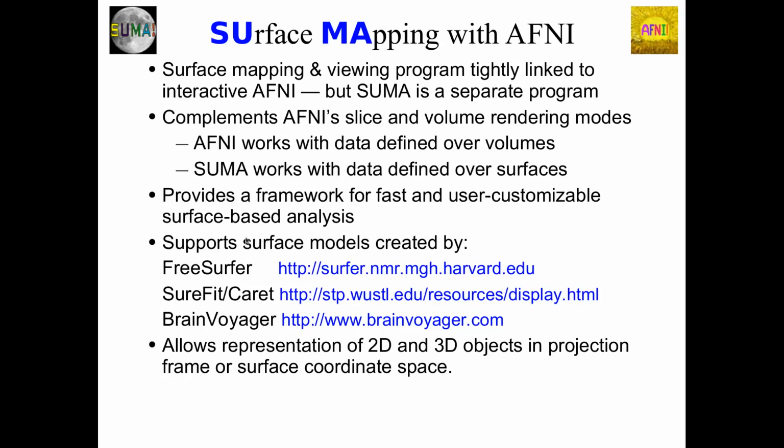A lot of the same kind of functionality and development style from the main AFNI programs also applies to the SUMA programs. And one question is, where do we get the surfaces from, these kind of nice anatomical surfaces that we see? We can generate surfaces in AFNI, but for really very detailed ones we leave most of that estimation to other people. So we have programs that will make surfaces of ROIs or things like that.